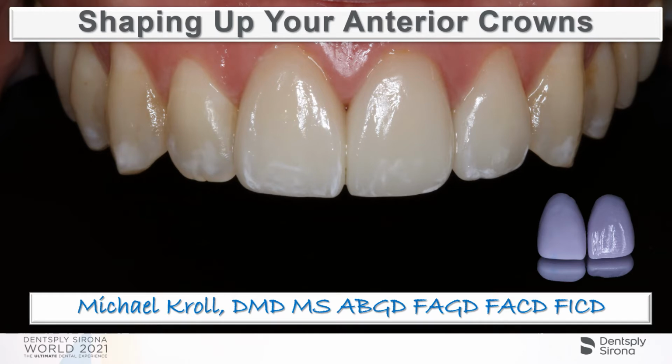So I'm going to be presenting on a topic called shaping up your anterior crowns, making the ordinary extraordinary by utilizing tools in the software and some simple tips and tricks that you can use in your laboratory as well.